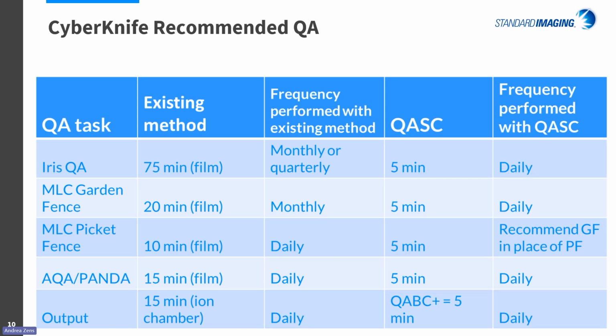Only QA StereoChecker has the speed, resolution, and field size to most efficiently perform QA. The software single-click workflow makes therapist mornings easy while providing the quantitative results physicists need to ensure patient safety.